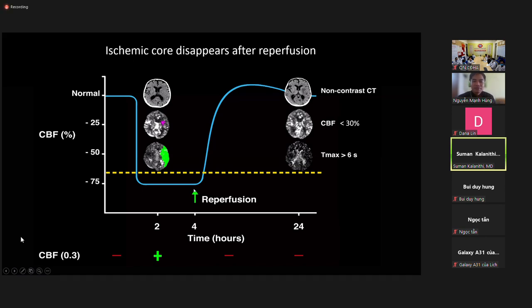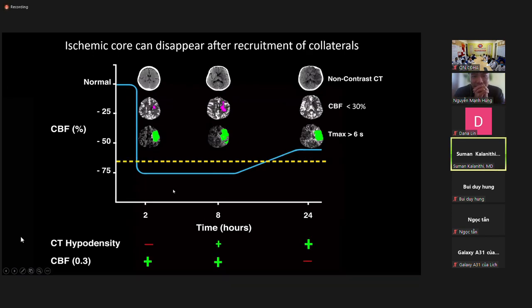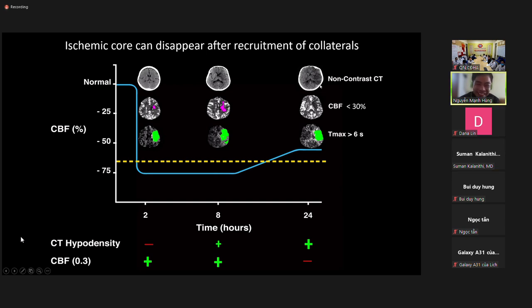But let's say they have a clot at home. Then this is your first scan. And then you look at this and you're like, what? This is obviously a new stroke. Why isn't it here? That's why I show you. And same thing here, you wouldn't be doing this and this and this, but again, this is your first scan, and you say, look, they have a huge stroke, what's happening? And then there's nothing here, that's what's going on. Yeah, very good question.